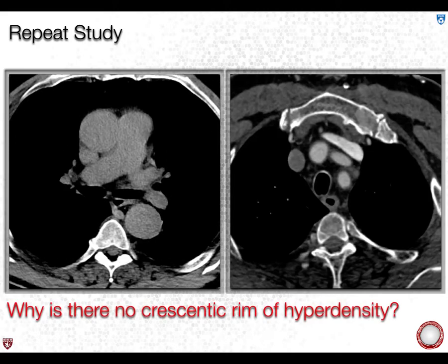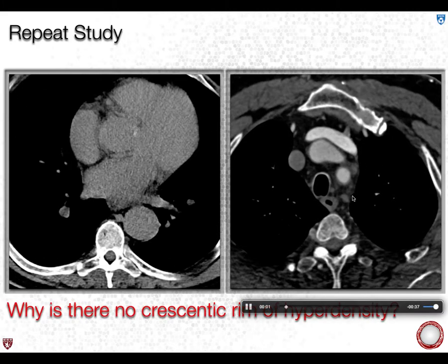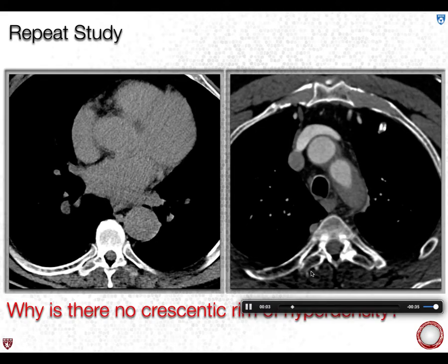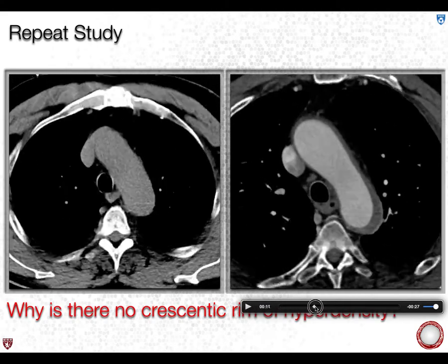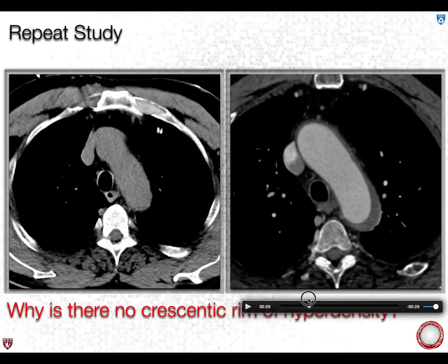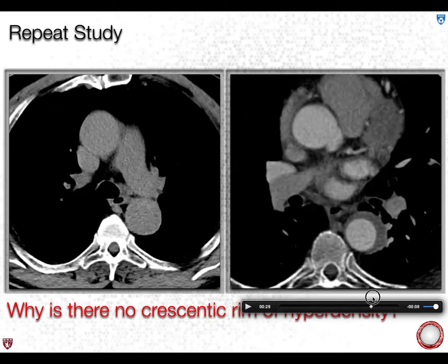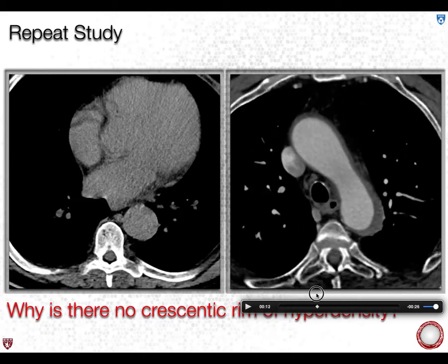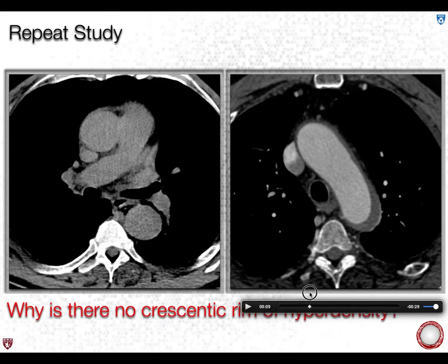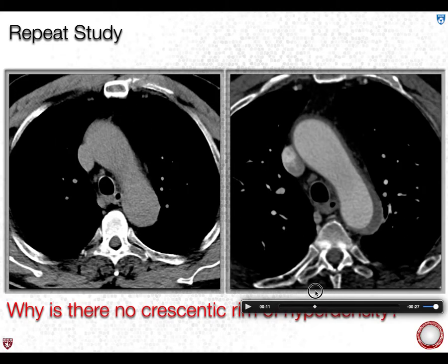We did have the contrast study, and this was an interpretation error. Do you guys think that's IMH? It looks just like the initial study, doesn't it?